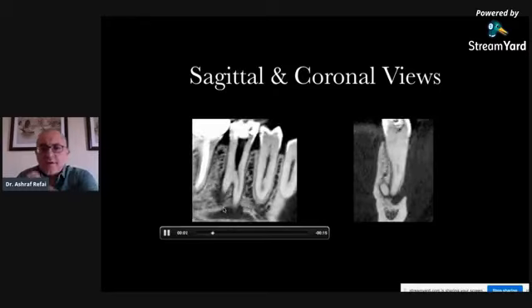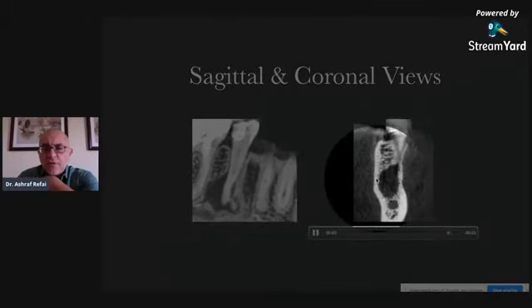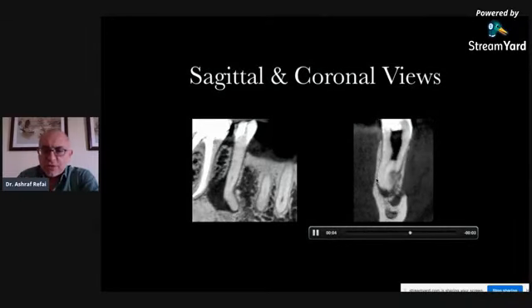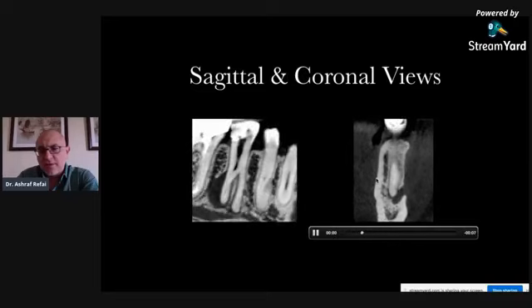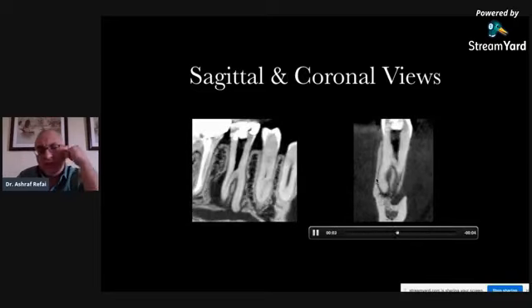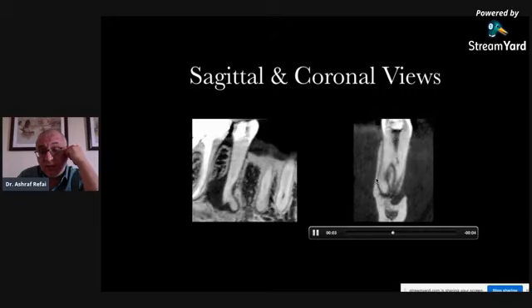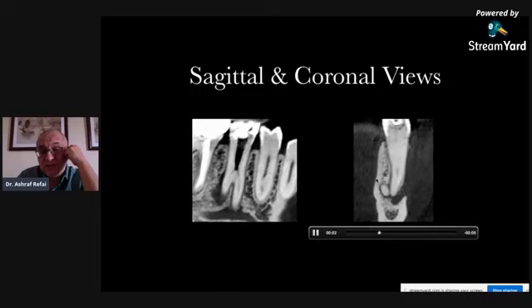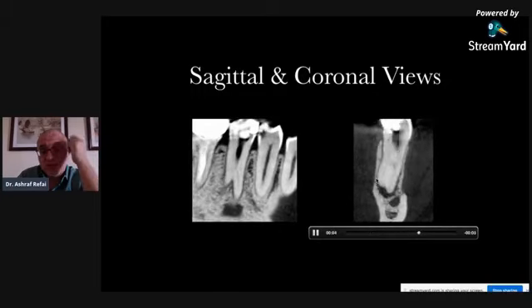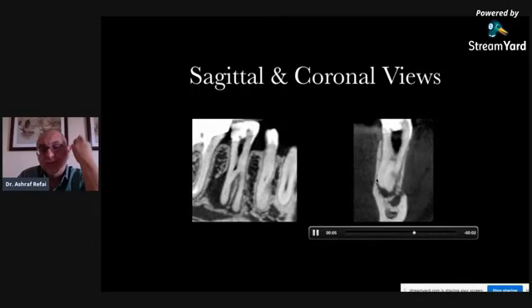And then the other CBCT here, you will see another one. This is the coronal view, and it's very obvious that one of the roots is actually extending into the mental foramen, just right there. So this was quite a very complex case. You have a mid-root trifurcation, 3 roots in a premolar, and you have lateral exits. You have also a deflected root or a curved root. So this makes it quite a tough case, although it's a simple premolar.